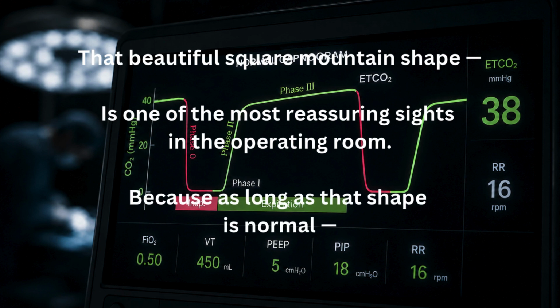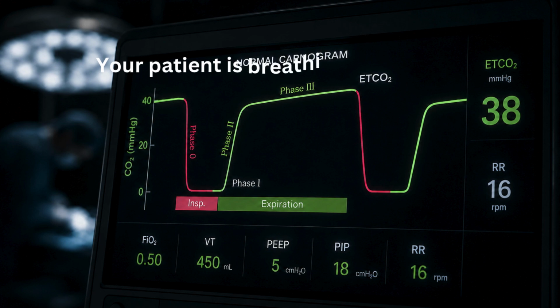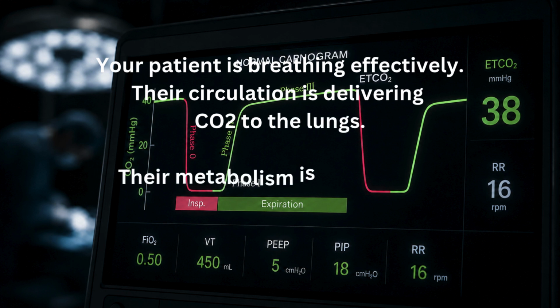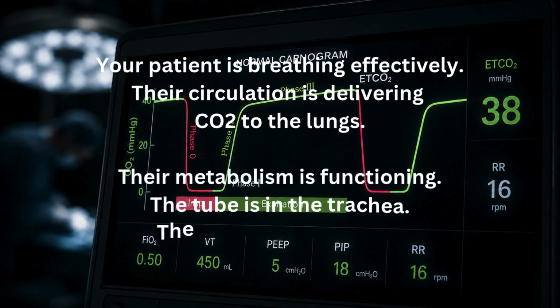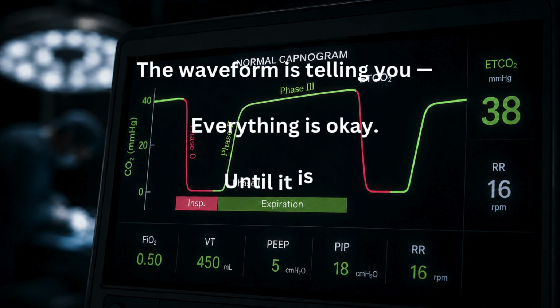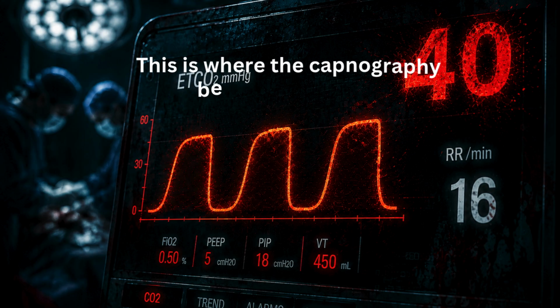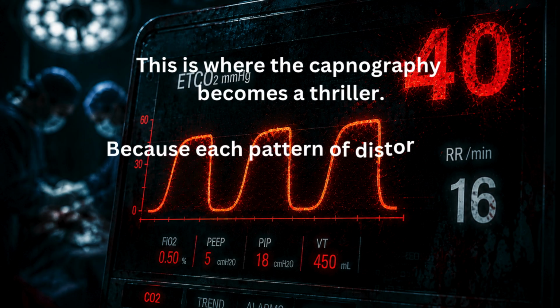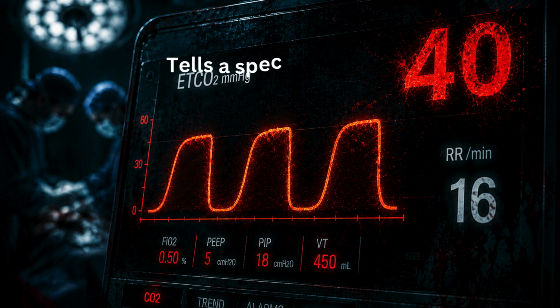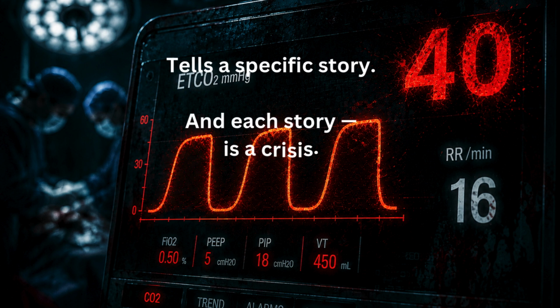Because as long as that shape is normal, your patient is breathing effectively. Their circulation is delivering CO2 to the lungs. Their metabolism is functioning. The tube is in the trachea. The circuit is connected. The waveform is telling you everything is okay, until it isn't. This is where the capnography becomes a thriller. Because each pattern of distortion, each deviation from that beautiful square mountain tells a specific story, and each story is a crisis.